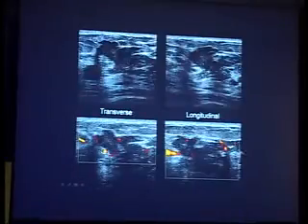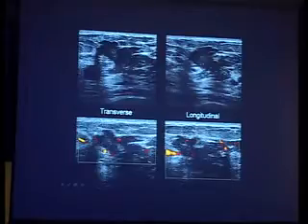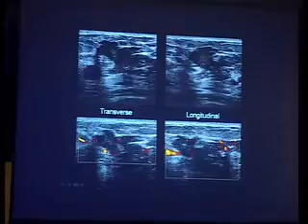Case 15, this is a little companion case, because she's also youngish. I think she was like 30, 31. That's young, okay? Really young as I get older myself. So longitudinal, transverse. What we have is a Doppler, corresponding, this is a palpable lump, again, because she's young. I think she was like 29. She did not get a mammogram. What do you think this lesion is?